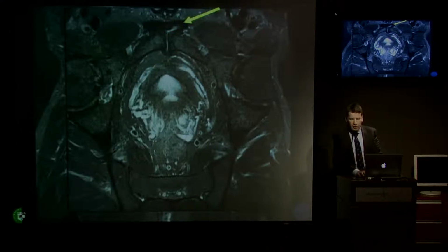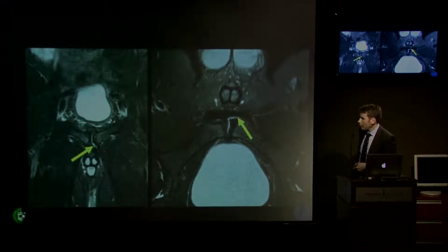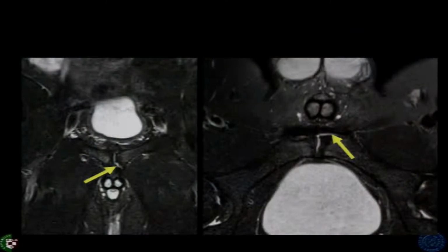So what was that proviso I gave you about gadolinium? Well, occasionally it catches me out. So if you look at this player, you can see they've got a cleft on the left on their oblique axial. So what side have they got their symptoms on? Well, if you looked at the literature, you'd say left, yeah? And, well, you can argue, does it really matter? They're going to get the same treatment anyway.